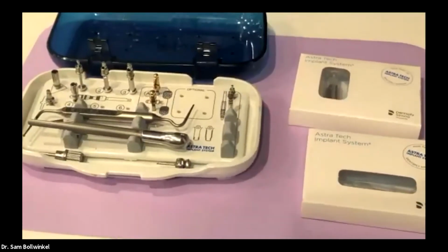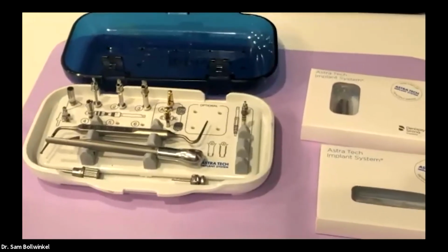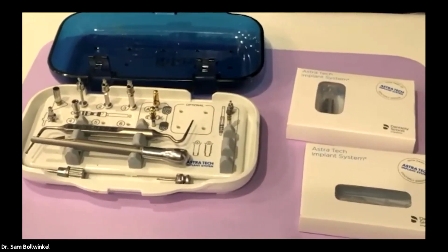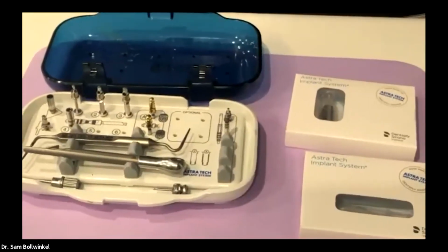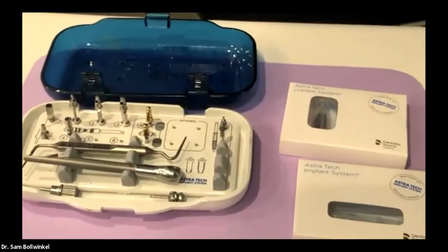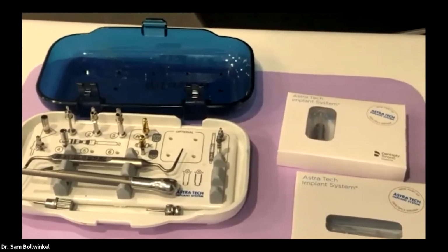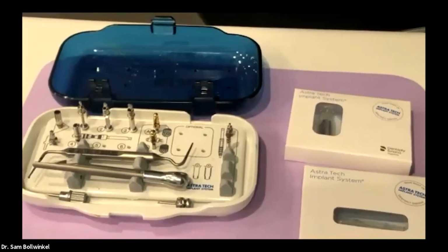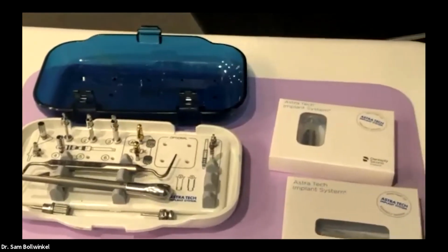When we go chairside, I've been doing implants in dentistry for a long time. When you can minimize how much is out in front of the patient, you scare your patient less. It's a great marketing tool to be able to provide a service that quickly and that efficiently that is not scary to our patient base. So with that, let's bring Carrie back.